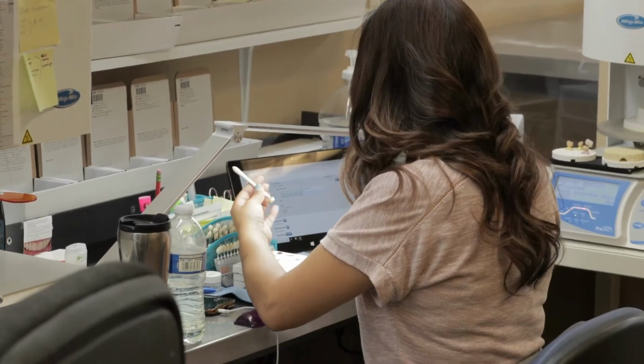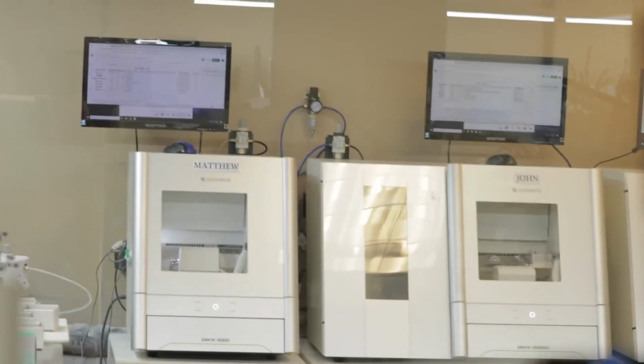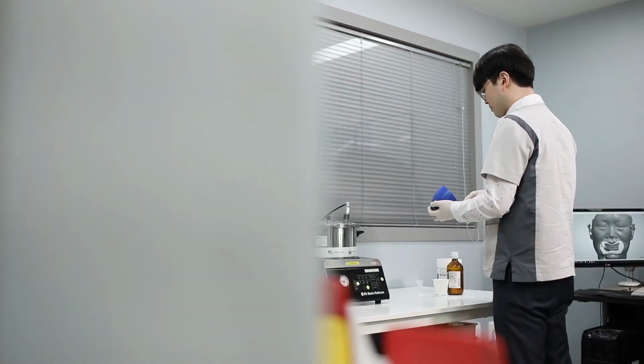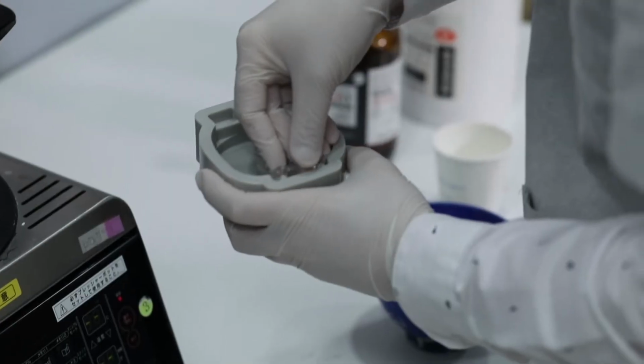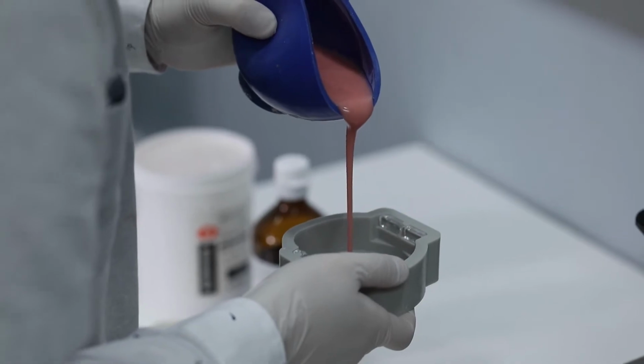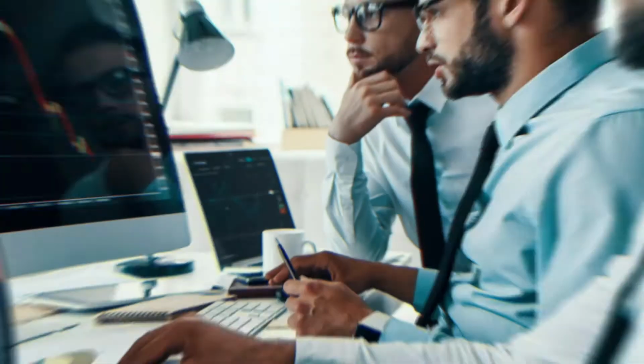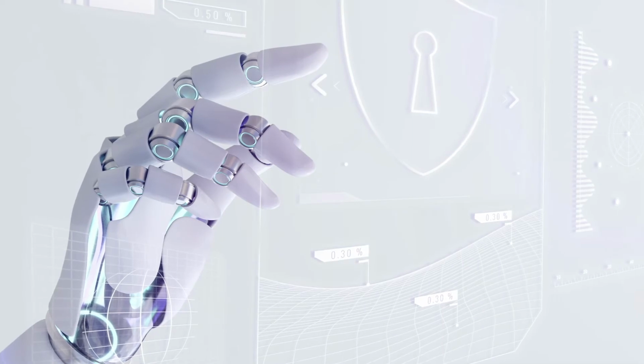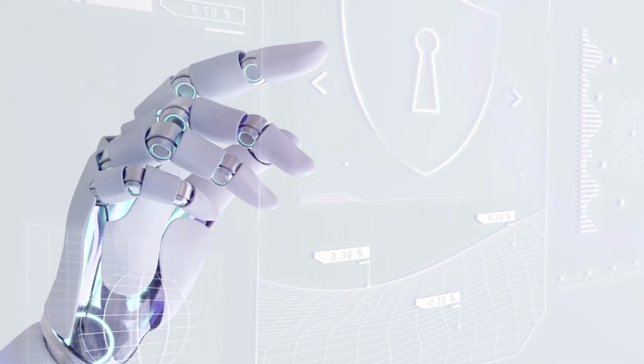Today's dental market chooses digital solutions for their speed of production, convenience, and the dependable output they offer. As dental businesses continue to increase their production capabilities by adding more 3D milling and printing devices, machine learning, data analytics, and AI will be the next wave of technology that helps them rise above the rest.